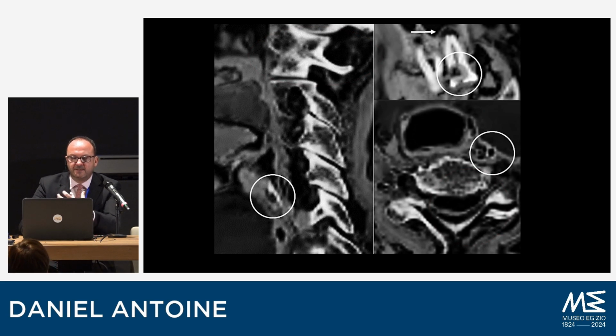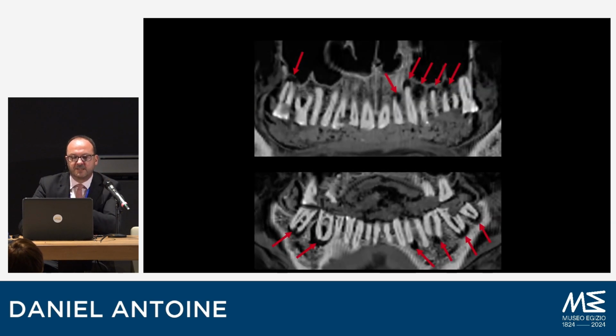As I said, the latest CT scans have revealed a lot of dental disease that wasn't identified before, in the top right, such as this tooth decay that's penetrated the tooth and actually affected the sinuses. But also the other two images highlight calcifications in the arteries linked to cardiovascular disease. And as I just said, 18 dental abscesses, not just one. Well, actually, there could be granuloma or cysts, but I won't go into technicalities at this stage. That's because his teeth are very worn, exposing the pulp chamber and allowing bacteria to enter, creating very large infections. And the bone at the tip of the roots has moved away. You can see these circular lesions where the infection is located.